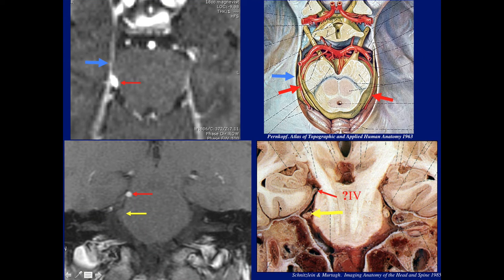And if we look at the coronal plane, even on this anatomic, where many structures are outlined, the fourth nerve was not outlined. Maybe this is the fourth nerve. Just because it's so tiny, it was hard to identify it. But here we see the enhancement and the enlargement and the appropriate location for the fourth nerve. Here's the trigeminal, which doesn't enhance. And this was never operated on, but was considered to be a schwannoma of the fourth nerve.